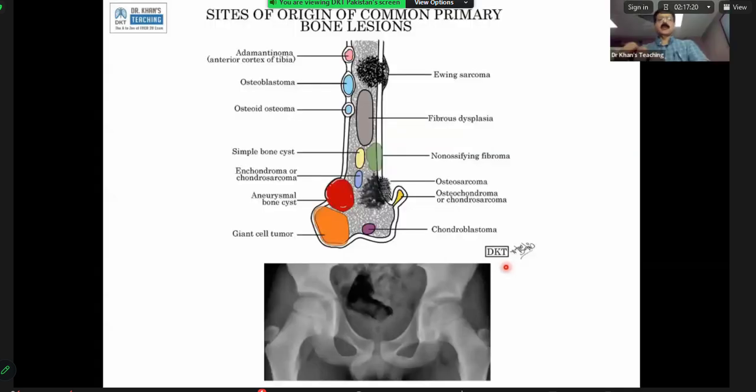Okay. So now the point is, in the real world, what will happen? This is the case of, again, osteomyelitis. Similar to the first one which I showed you, in terms of anatomy, it was a metaphyseal lesion. It is a lytic lesion with some sclerosis. Fat planes are there, but I think part of the hint is that the patient was symptomatic.